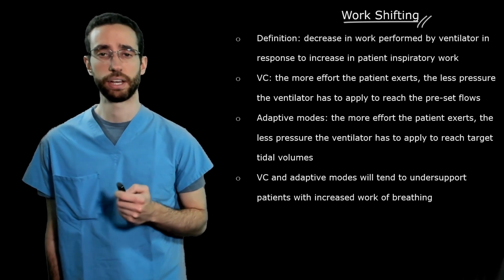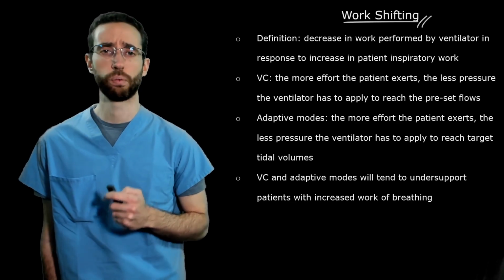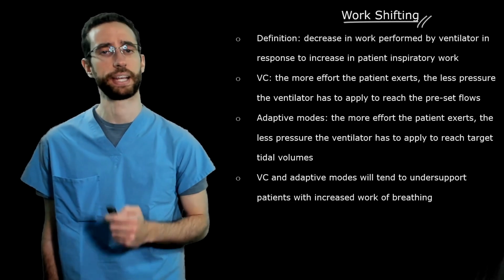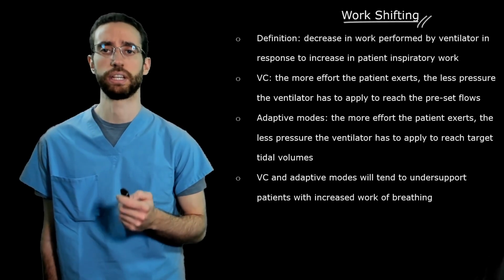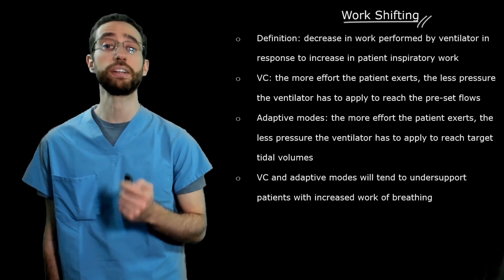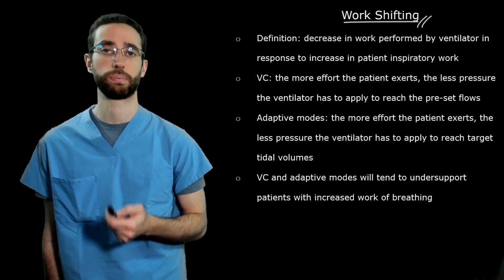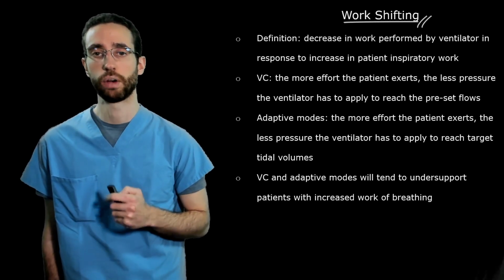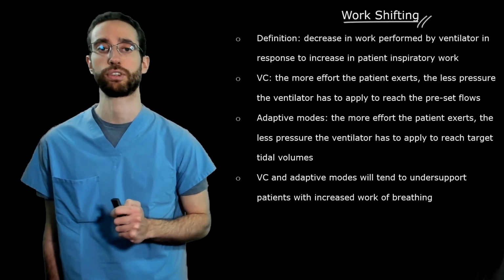Regardless of the mode we use, our waveforms can give us an idea of how much effort the patient is exerting. In pressure-limited modes, we will see a decrease in airway pressures and an increase in inspiratory flows in response to patient inspiratory effort. In flow-limited modes, we will only see a decrease in airway pressures.